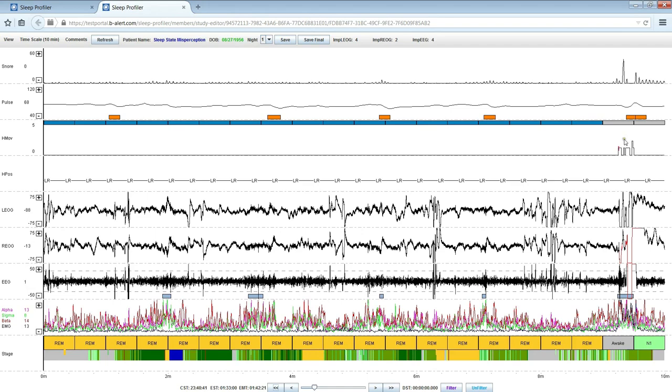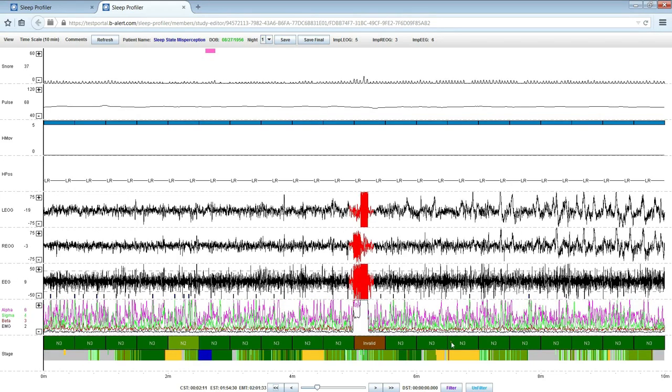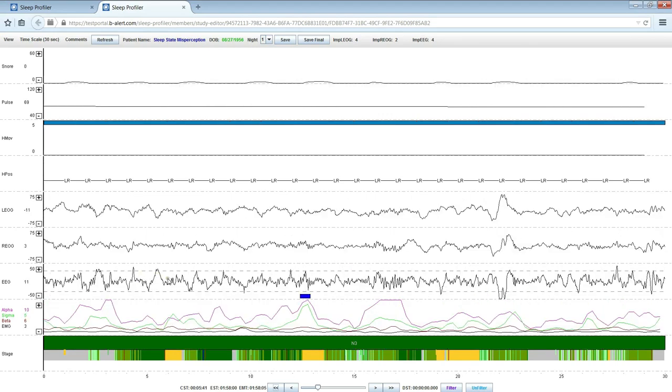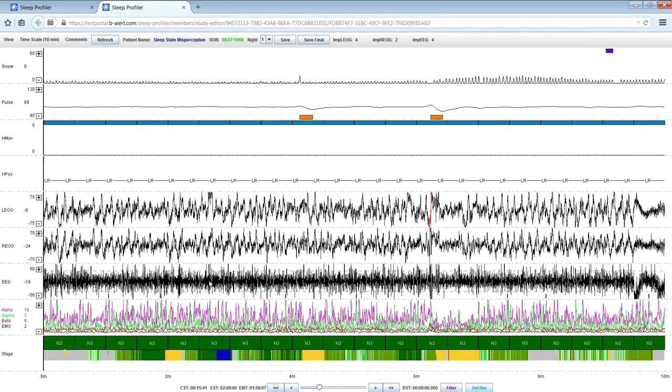Here the patient awakens. You can see the movement, and they begin to transition back to non-REM sleep. They've transitioned again to N3 sleep, and here is the delta activity confirming the appropriate stage. Press page down and the right arrow.